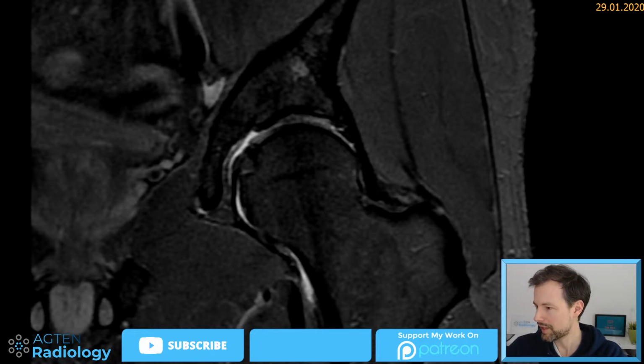Yeah, Norway. Hi Norway, that's great. Which app do you use to analyze these pictures? This is just a PACS viewer. It's called Merlin by Phoenix Systems. It's a German company. It's easily the best PACS viewer out there. I still have to see a better one, so it's a good one, really.